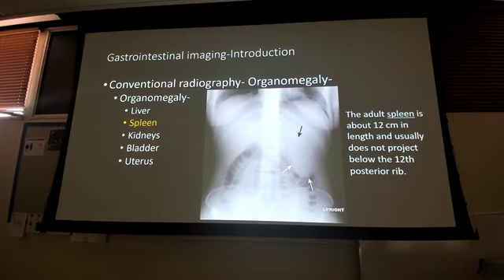Because the concern we have here now is if my spleen is projected past the 12th rib, what's the problem with that? It's not protected. Spleens can rupture fairly easily, especially if they're enlarged or they're inflamed. So now I don't have the ribs to protect it. That's why we want the spleen to be under the ribs. We want it fully protected.